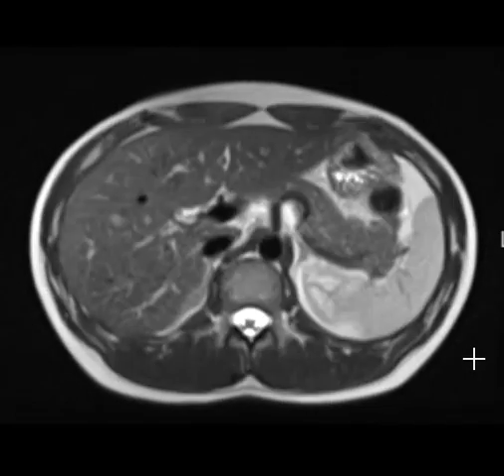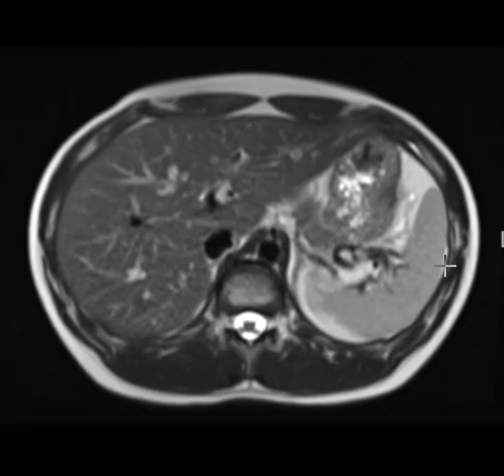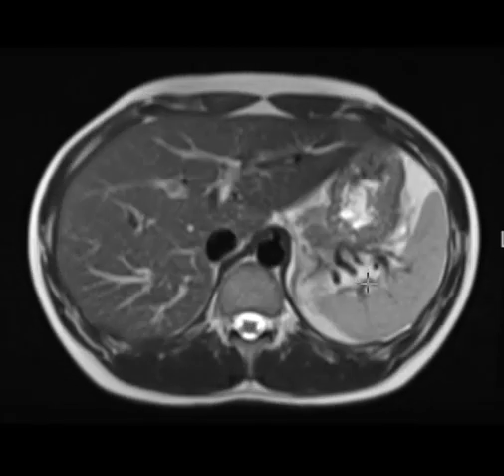So what is the spleen? Where is it located? This is the spleen in the left abdomen here. I'm outlining it. The liver is on the right side. Here's the left side, and we see this gray structure. Usually it's a little bit brighter than the liver on this sequence. We look at this to see if it's smooth. We look at the size, and we look at the homogeneity.